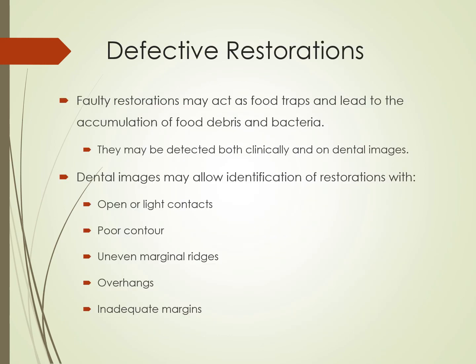All right, so our next topic is defective restorations. We're going to go through a couple of these. You could look at images all day with defective restorations. So faulty restorations act as food traps, okay?